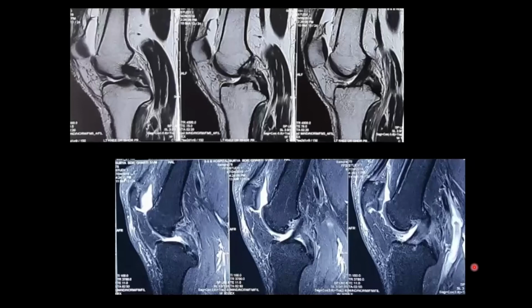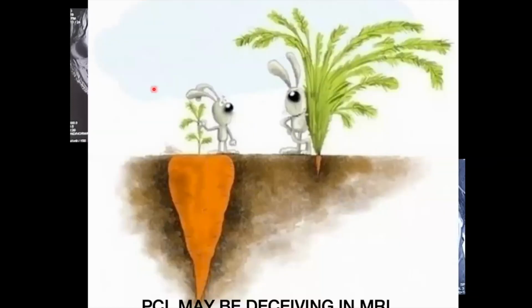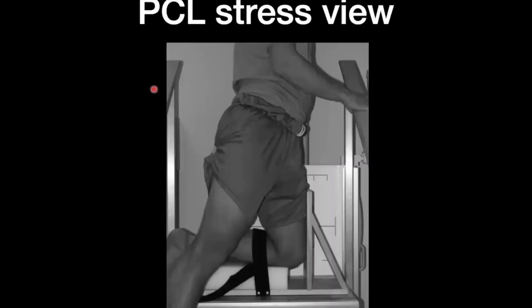But we must be very cautious to report the integrity of PCL in chronic PCL tear, because in chronic conditions, if we do MRI, the clinically non-functioning PCL may be seen as an intact PCL, just like this picture. So chronic PCL tear may be deceiving in MRI. We must be very careful.